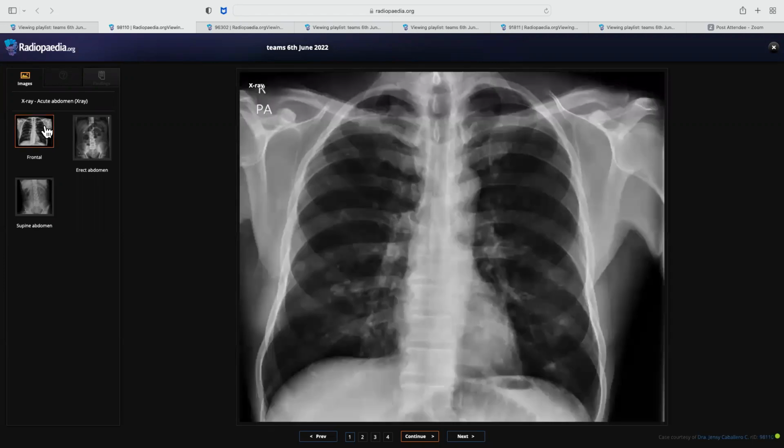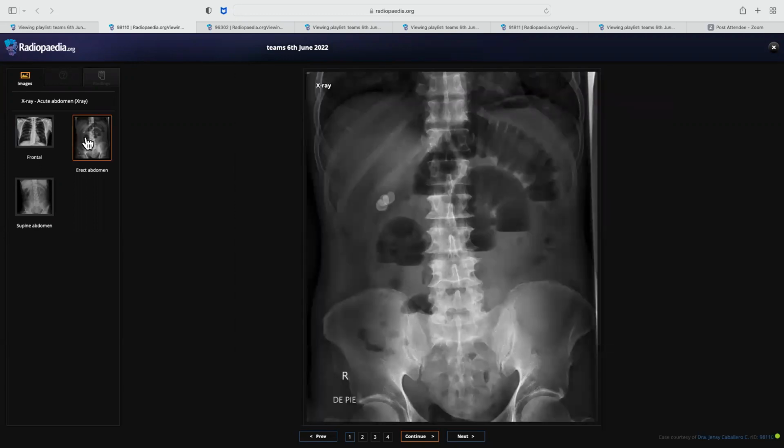Okay, can you come to a unifying diagnosis? You saw some lung nodules here, and then you saw this bowel obstruction. So does any unifying diagnosis come to your mind based on these radiographs? Yeah, these multiple nodules within the chest can be due to metastatic deposits from a primary sitting within the bowel, which may result in intestinal obstruction in this case. The patient is a known case of malignancy, you are right.